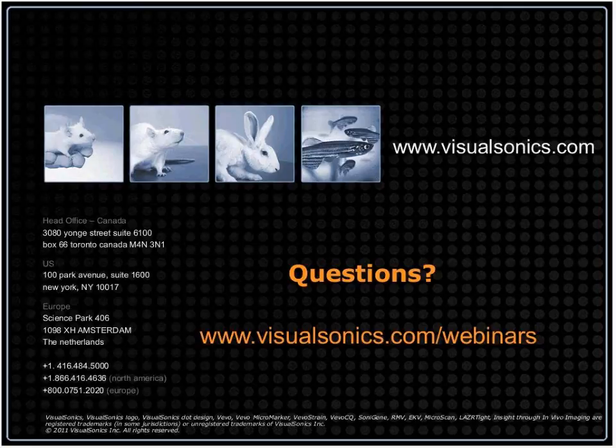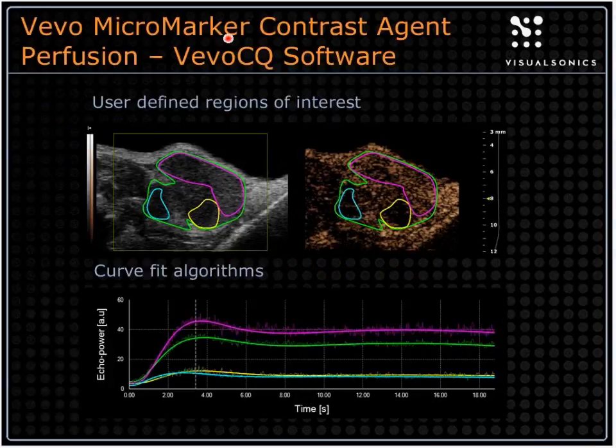Okay, thanks. So the idea behind the 20 seconds is that generally for most tissues, a 20-second stream of images gives time for the microbubbles to perfuse into the area of interest and to come up to a constant circulating level of perfusion. So if you think back to the curves that we showed, this allows you to reach a peak level of circulation.